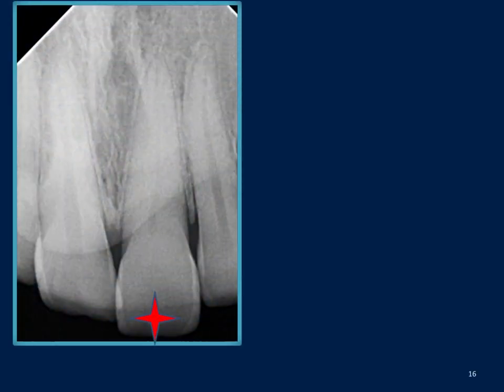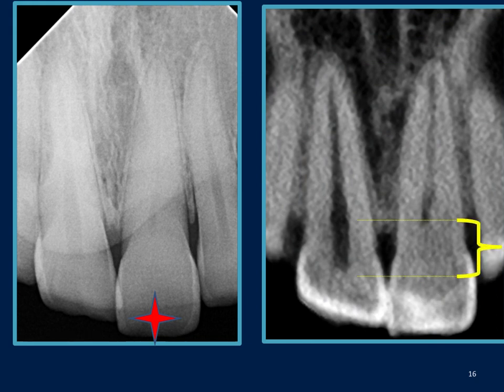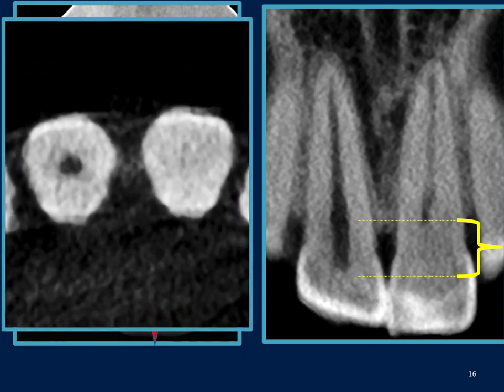When you look at this central incisor, which had a trauma 3 months ago, and compare it to the neighbor tooth, you can see the shadow of canal starts maybe 7 or 8 millimeters from the tip of the incisor. So I do not feel comfortable with this tooth. Let's take CBCT. CBCT will show us this tooth has starting calcification in comparison with the neighbor one. If we wait more, this calcification will calcify the whole canal and will block it. In this case, I prefer to make root canal treatment before calcification occurs completely, and by the way, the tooth starts to discolor.